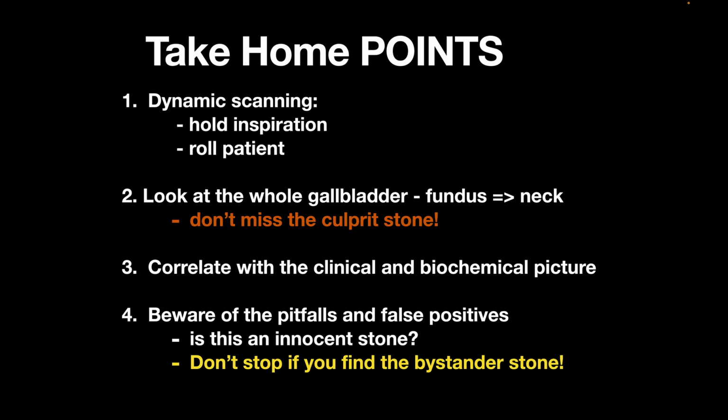Remember, always look at the whole organ. We'll say this again and again. Look from the top to the bottom, from the left to the right, front to back, fan through so you're looking at the whole thing. And in gallbladders, it's all about getting a good view of the neck. Don't miss that culprit stone down on the neck of the gallbladder.